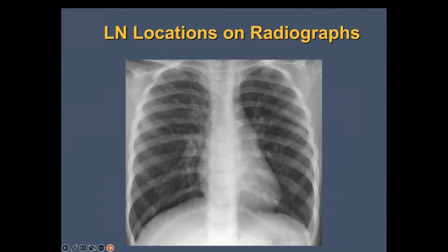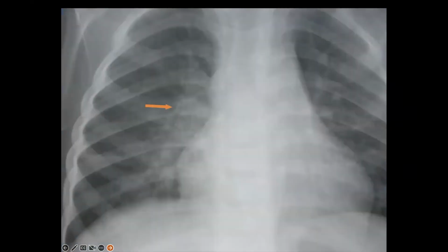Now, when you look at a chest x-ray, you may see a lot of stuff in the hilum, and it may look kind of bulky to you. Often the vasculature makes us be concerned that we might have too much there. But if you look closely at this right hilum, notice that those vessels sort of branch out and you have a concavity between the vessels. And that tells you that this is all just vascular markings. Branching things that radiate out from the hilum are just vessels.